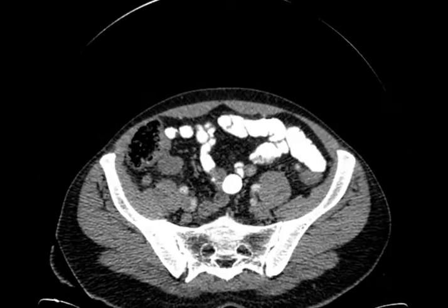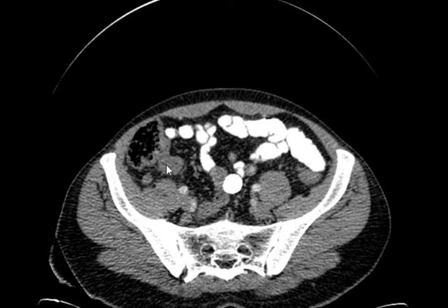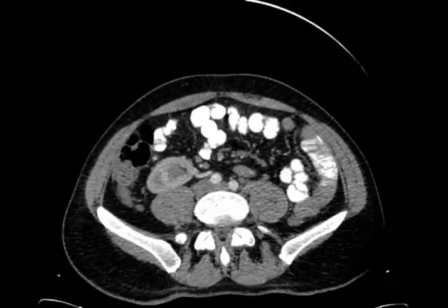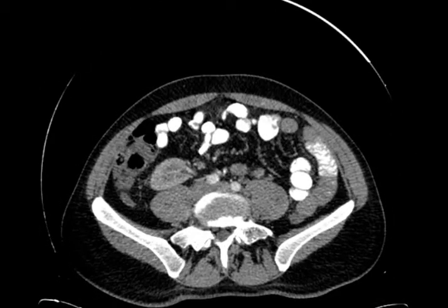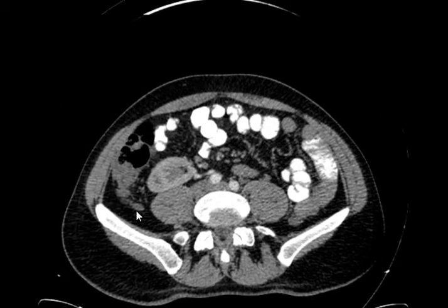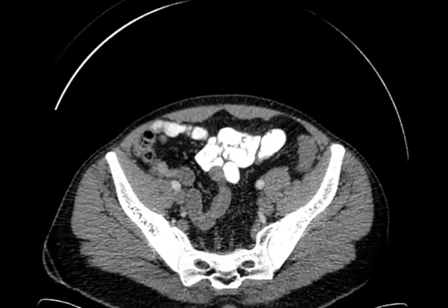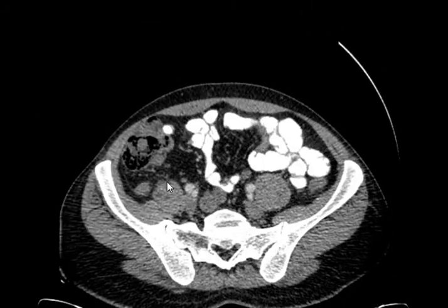So first of all, this is the terminal ileum joining the cecum. Okay? What's this here? How to know it's the appendix? Follow it up. It should connect. Find it. A blind-ended structure. Stop, don't move the mouse. See, now this is connected here. If you follow it, you can see it here. See? Okay. What's its diameter? It's 1 cm in diameter.